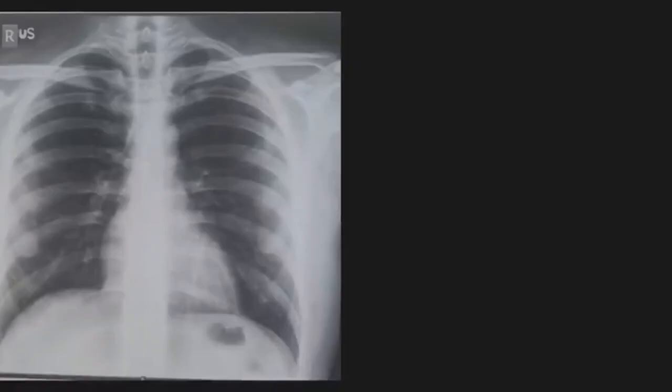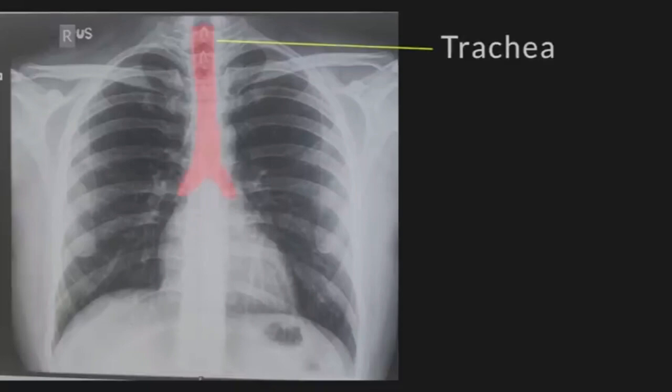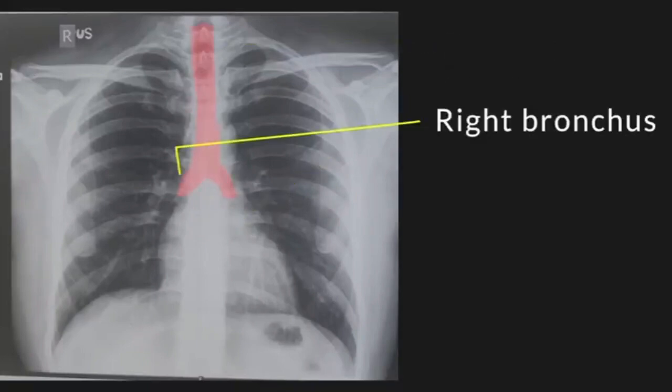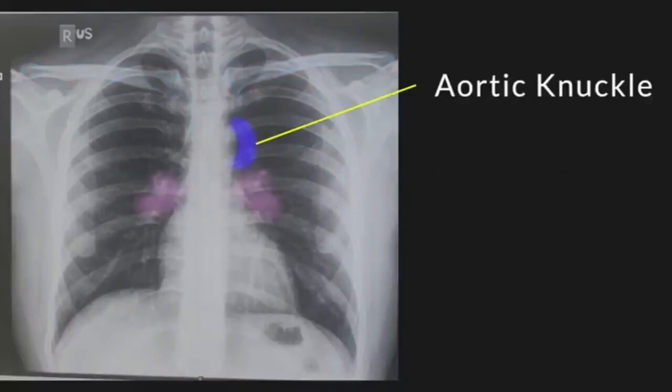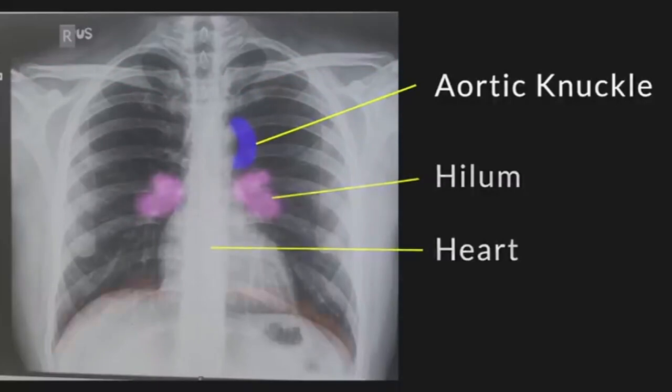Today, we're looking at something you've definitely seen hanging on a light board in a hospital right now. Right, a chest x-ray. Yeah, exactly. To most of us, it's just this blurry Rorschach test of ribs and gray blobs. It really is, but for a doctor, that gray blob is literally a life-saving map.